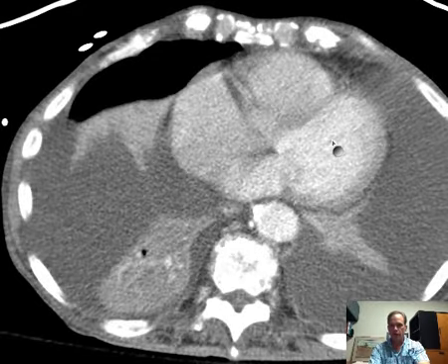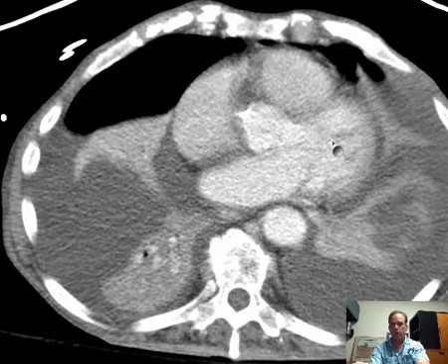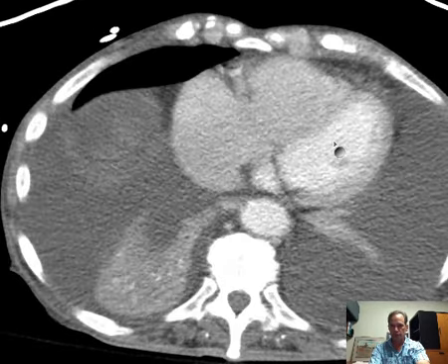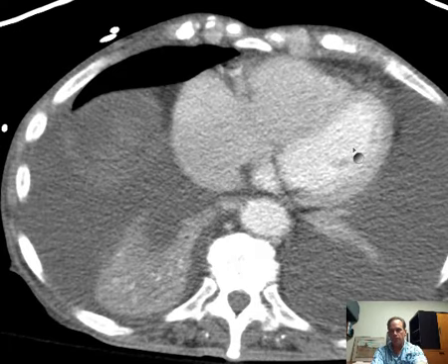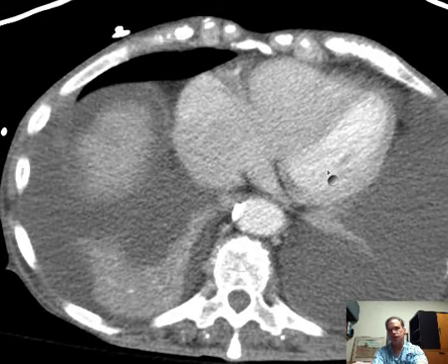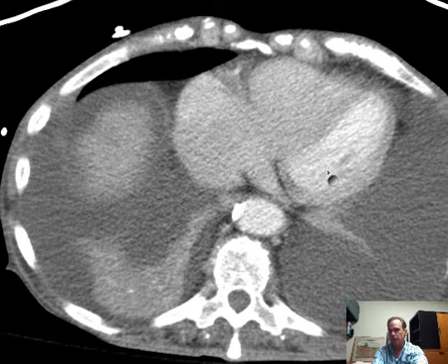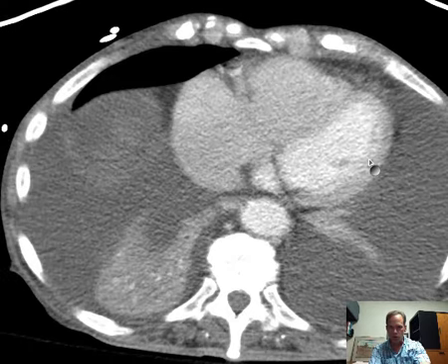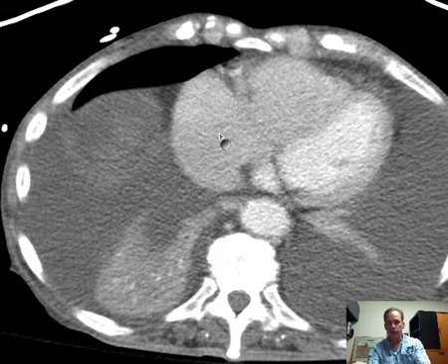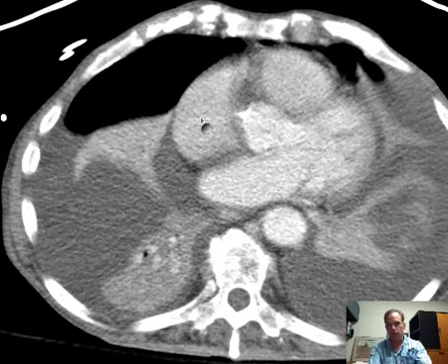So the left heart is referred to when we talk about the left atrium and left ventricle, and the left ventricle is the primary propelling element that contracts with great force. And because it contracts with such great force to supply the entirety of the body with the exception of the lungs, it has a very thick muscular wall. Now, this is not the thickest example, but you can see that it's clearly thicker than the right ventricle, which is not even discernible as a clear structure. The atria have contractility, but they have a very thin wall too.